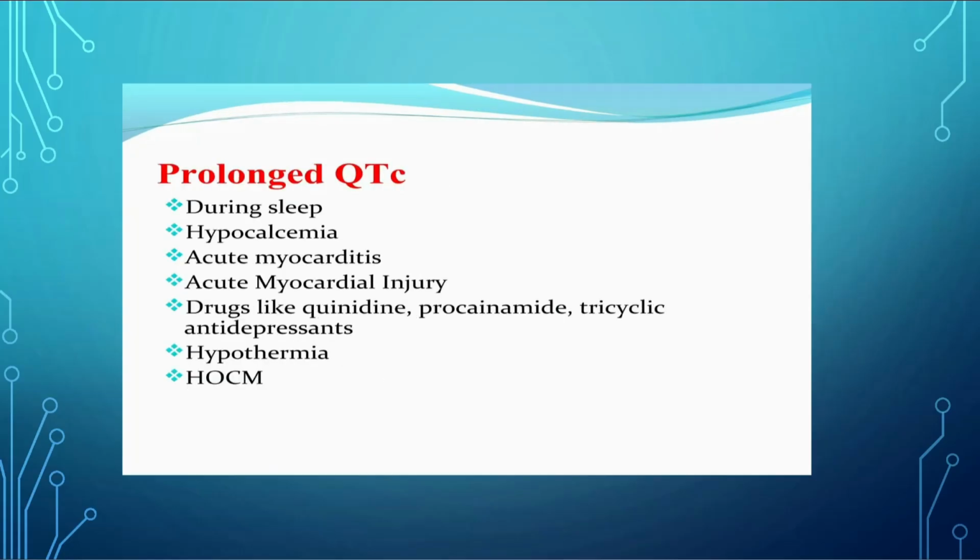Now where you will see the prolonged QTc, that is corrected QT interval.